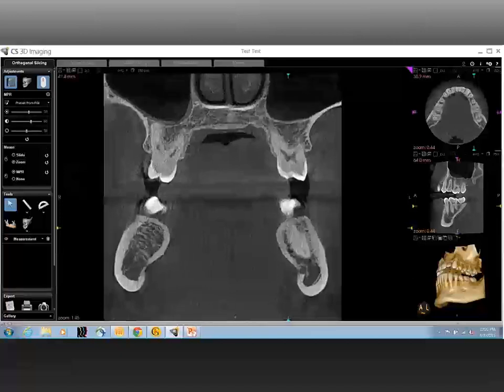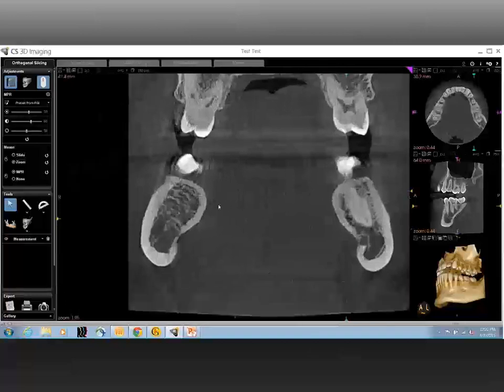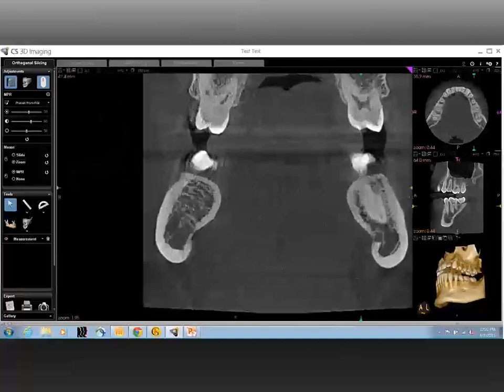Since the traditional way of examining bone density cannot be applied to CBCT, it is imperative to go through all these three different types, or for lack of better words, different parts of bone, to understand a certain pattern in how the bone could look different from one side to another or between two different individuals.